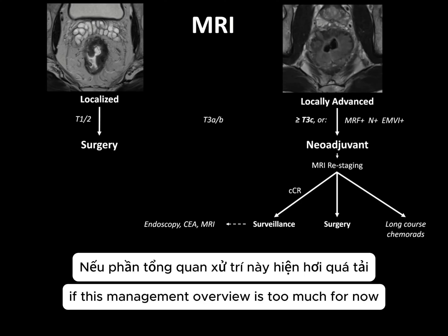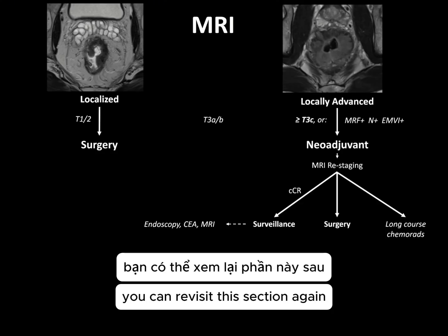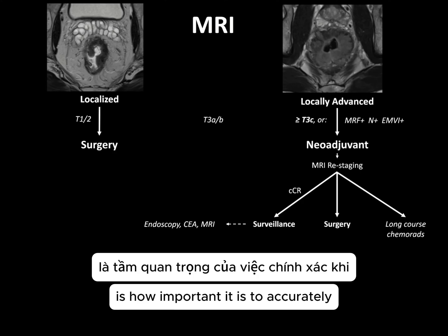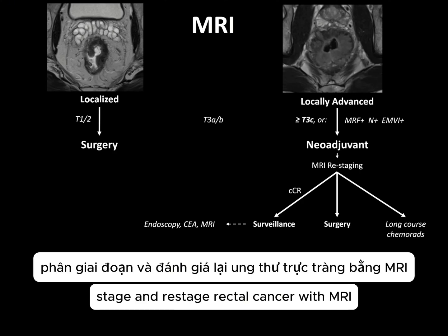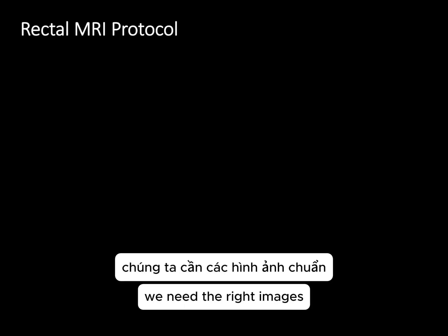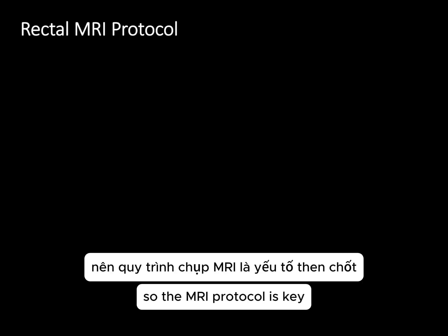If this management overview is too much for now, that's okay. Once we cover the anatomy and staging, you can revisit this section again. The most important thing I want you to take away for now is how important it is to accurately stage and restage rectal cancer with MRI. To accurately stage with MRI, we need the right images and they need to be good quality. So the MRI protocol is key.